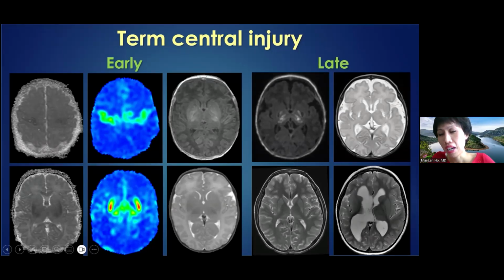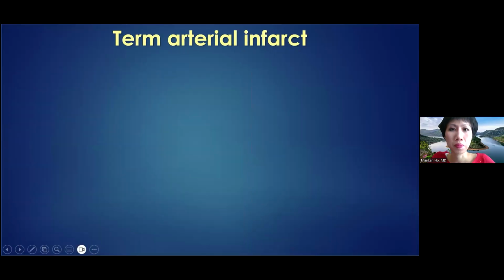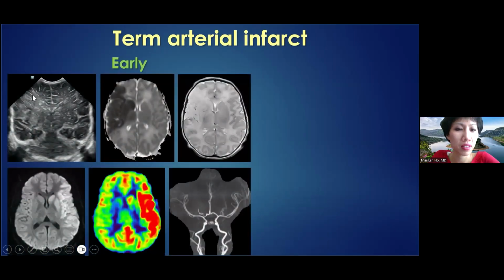So this person, right hemisphere involvement, they're going to have more left-sided symptoms. Okay, you can have large artery infarcts in term babies. It's not too common, not like adults, right, who have strokes all the time. But again, on the MCA stroke, on the ultrasound, restricted diffusion, edema, again, edema on top of a watery brain can be hard to see if it's more subtle.